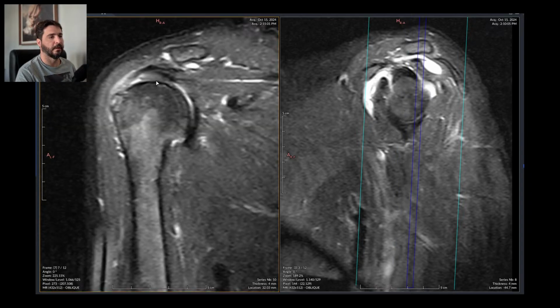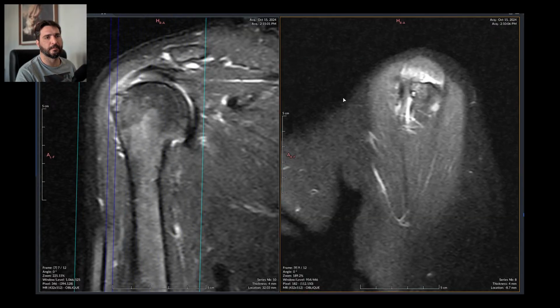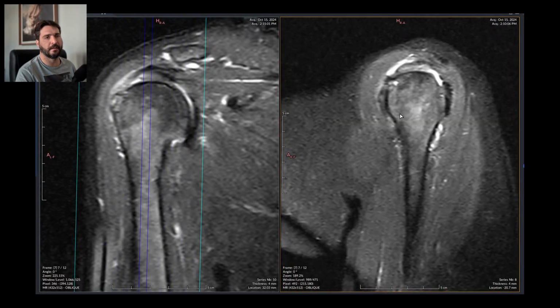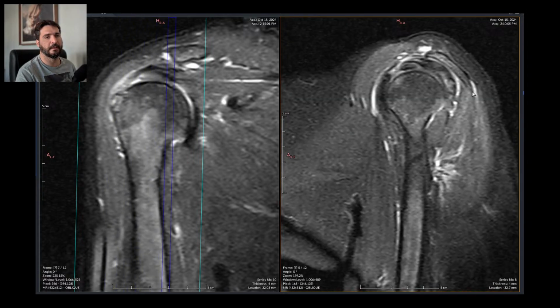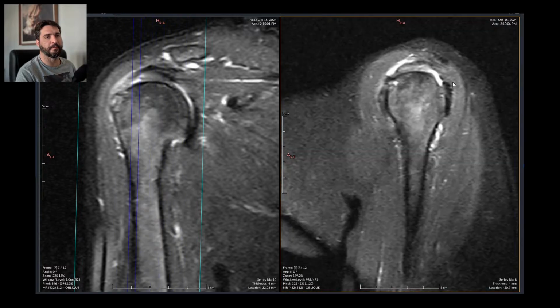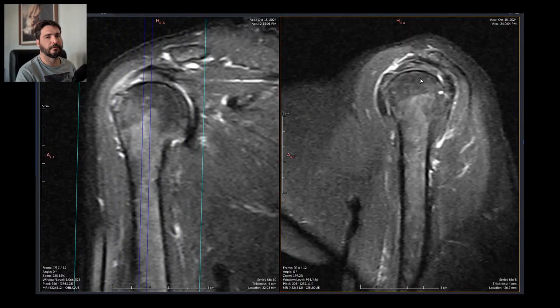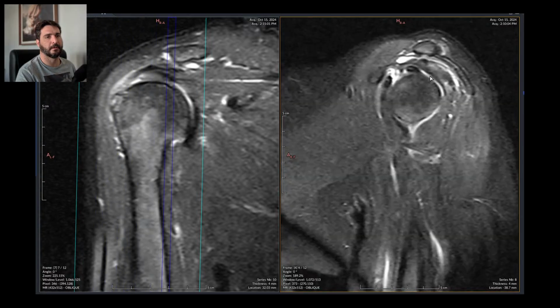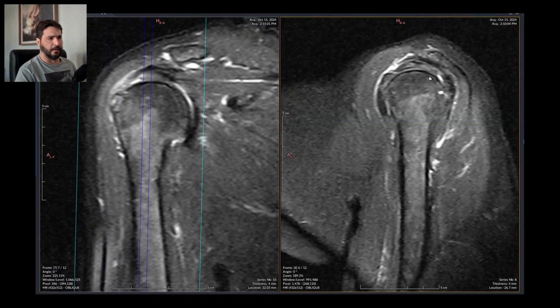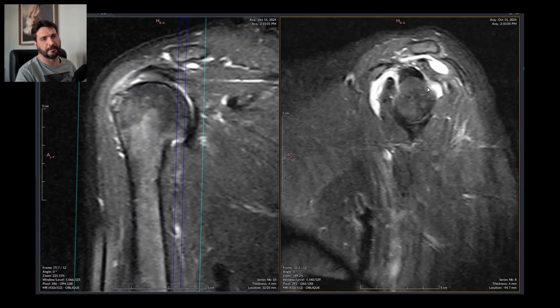And we know the motive for such bursitis. It's a rupture of a tendon. Which tendon is this? Let's see. This is most probably, yes, a partial tear of both the supraspinatus and the infraspinatus tendon right here, upper portion of the infraspinatus, and the posterior portion, the lateral portion of the supraspinatus. So this is a partial tear.